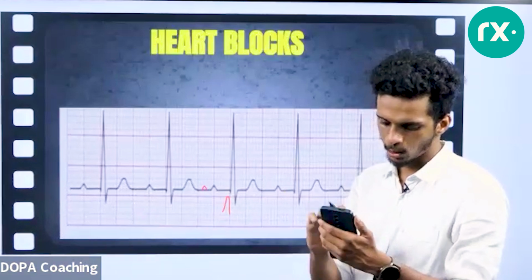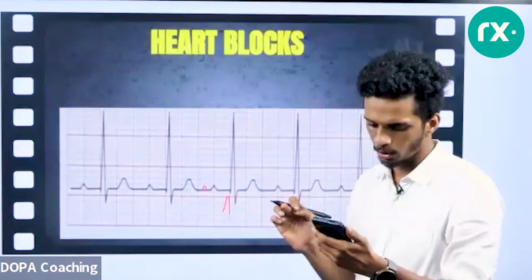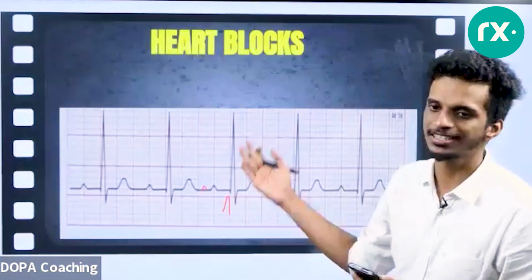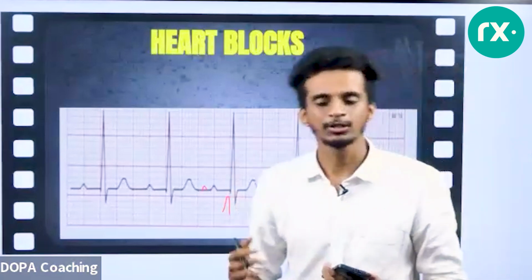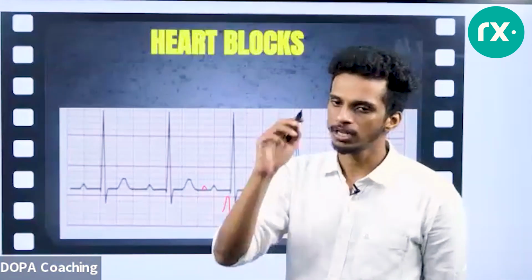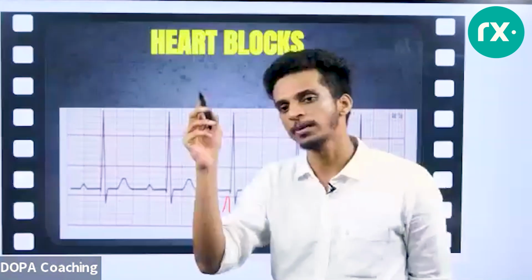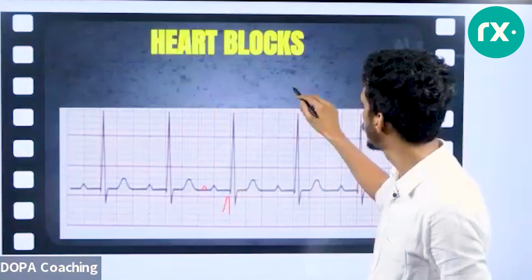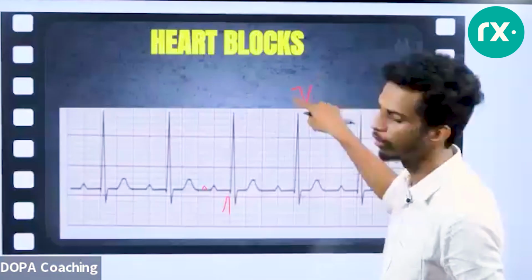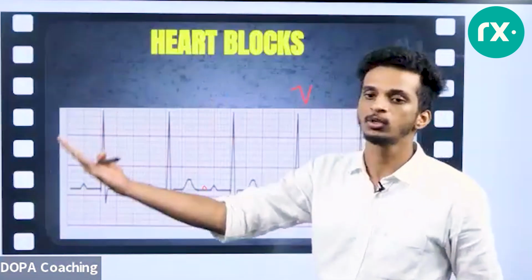Okay. So, how to differentiate between acute and chronic changes in ECG? I think you are asking whether a change is an acute MI or an old change. Actually, you have many methods to differentiate between acute and chronic changes in MI. For example, one is the Q wave. Q wave usually occurs in old ECGs, like old MIs. If you find a pathological Q wave, a very deep Q wave, more than one third of the QRS complex, it can be an old change. Second, we can ask the patient for their old ECG.